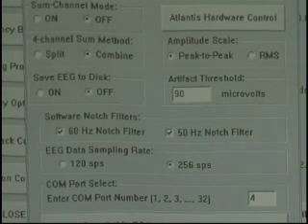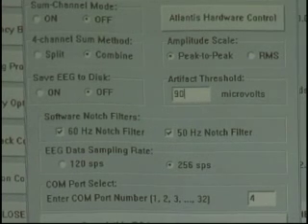Thus, if it's at 90, you see the 2 pink lines, you can adjust them in and out real quick and easy. Boom, done. Does that make sense? It'll make more sense when we're at the training screen and we're watching it. You'll see it's real quick and easy to adjust then versus guessing where it's at.